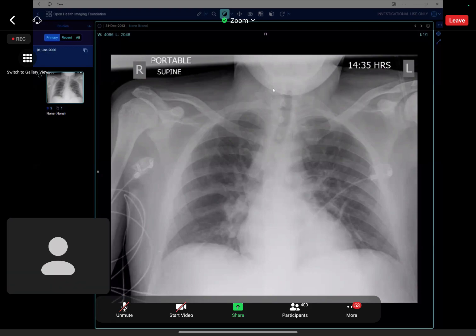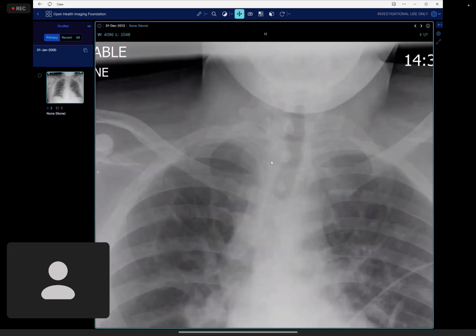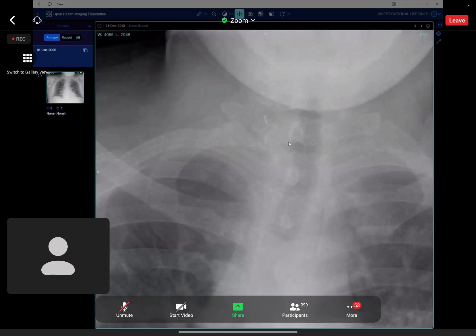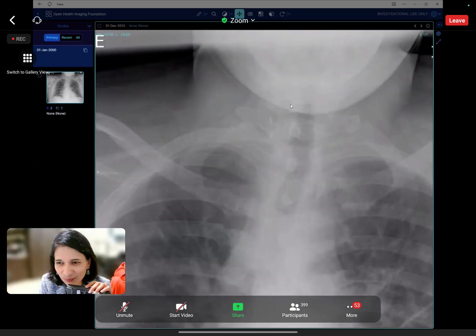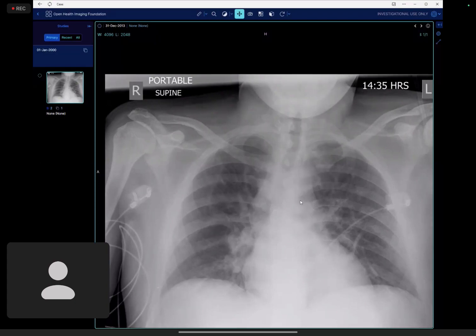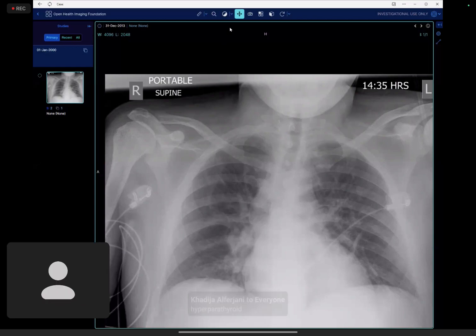Sorry, it's probably the resolution being a bit low, but is it paratracheal stripes? I can't really see. Oh no, there's that. Metallic clips, so yeah, after previous surgery. Is it a parathyroid adenoma? Yeah. Hyperparathyroidism is within the causes.